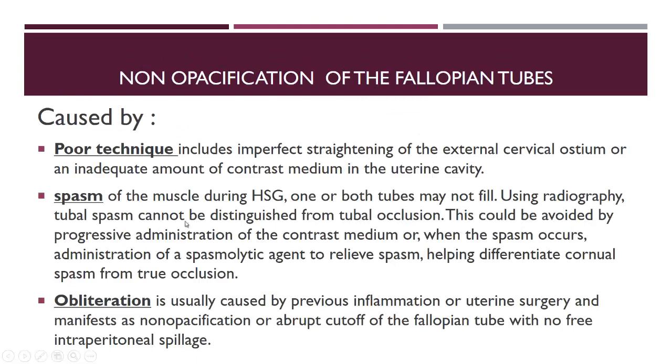Non-opacification of the fallopian tubes can be caused, most commonly, by poor technique, imperfect straightening of the external cervical ostium, or inadequate amount of contrast in the uterine cavity. If you have an underfilled uterine cavity, you cannot comment on the fallopian tube filling.